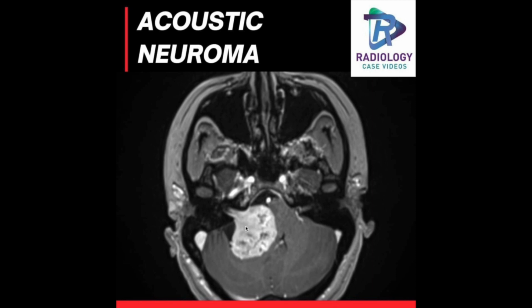The point to be remembered is you can call this as ice cream cone appearance only when the size of the tumor is less than 3 cm. When bilateral vestibular schwannomas are present, it is highly suggestive of neurofibromatosis type 2.